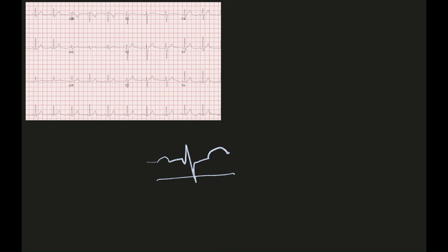It may vary from lead to lead. For example, it will be a little different in chest leads. It could have a variation in limb leads as well. So whenever an ECG comes in front of you, you need to see a few basic things.